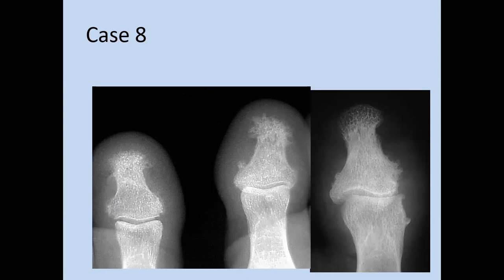Yeah, so do you know what the terminology is for this fluffy appearance of the tuft, and also for these protrusions here?